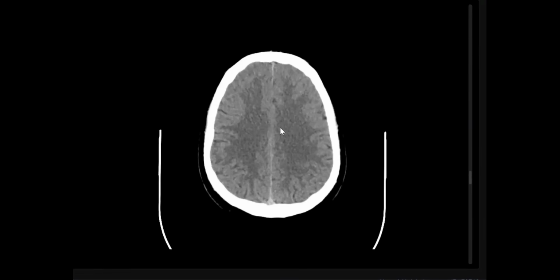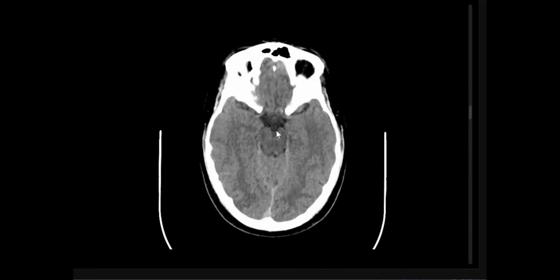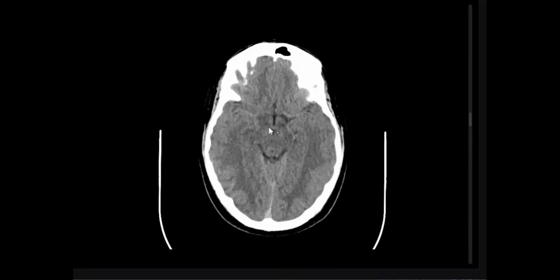Excellent. Here is another protocol: follow up after 10 days or 2 weeks, with complete resolution. So after a negative CT angiogram, according to local protocol, we may do a follow-up CT scan or a conventional angiogram. When to do a conventional digital subtraction? If the hemorrhage extended to the distal or peripheral aspect of the Sylvian, or the distal aspect of the interhemispheric fissure, so it is perimesencephalic but extensive. In such a case, even if the CT angio is negative, we may proceed to a conventional angio.